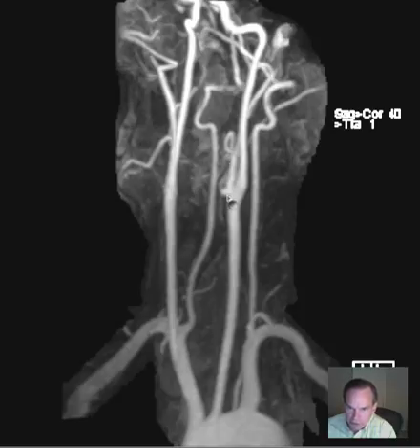Here you can see the left external carotid artery immediately giving off little branches that are supplying the soft tissues in that region of the head and neck and facial area. The vertebral artery courses superiorly in the foramen transversarium of the cervical spine at multiple levels, and then does this loop before it enters the cranial vault.